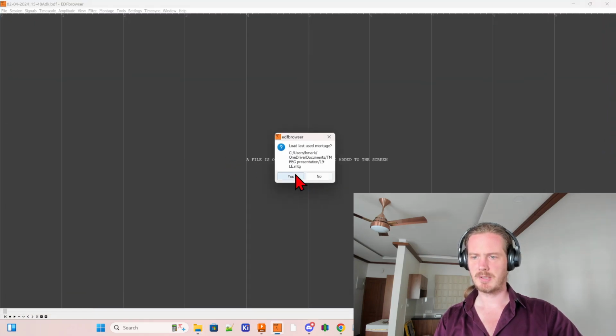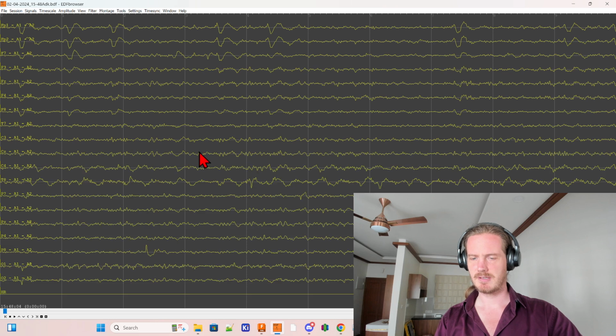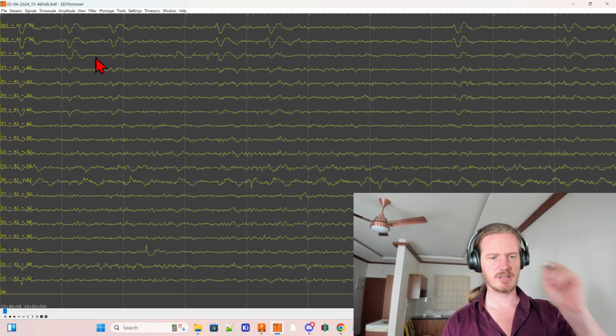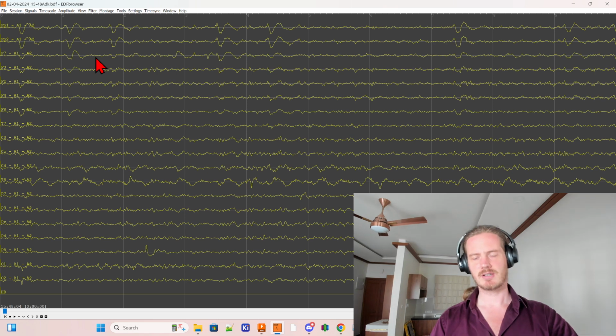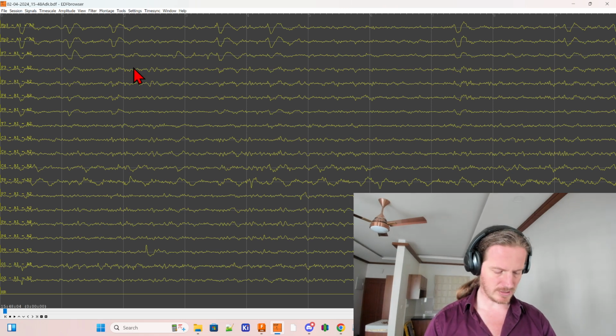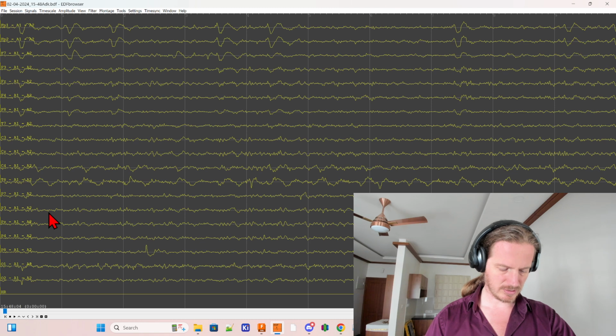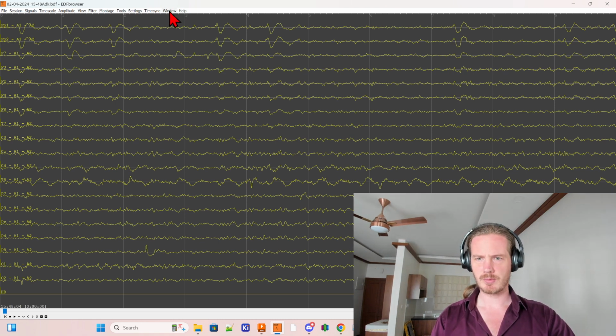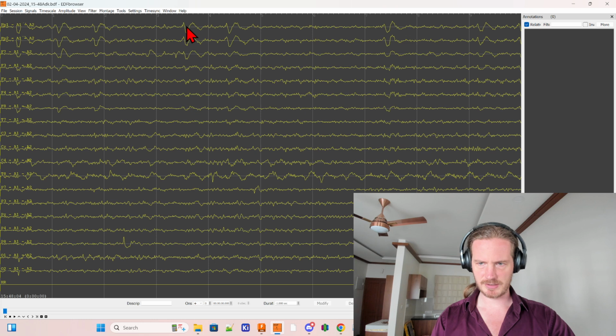I will load my previously used montage, and in my notebook over here, I've recorded exactly at what times they're closing their eyes or opening their eyes, at what times they're doing all those things. And so I have written here that at 2 minutes into the recording, they start with eyes open. So in their window, I'm going to open not just the annotations, but the annotation editor.